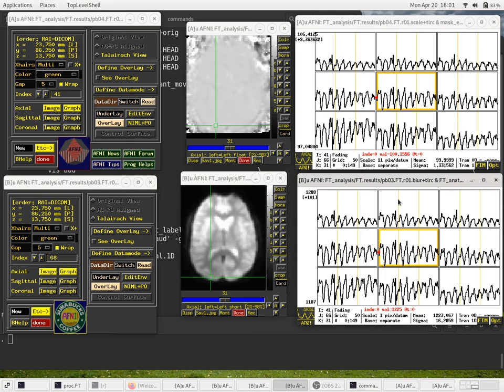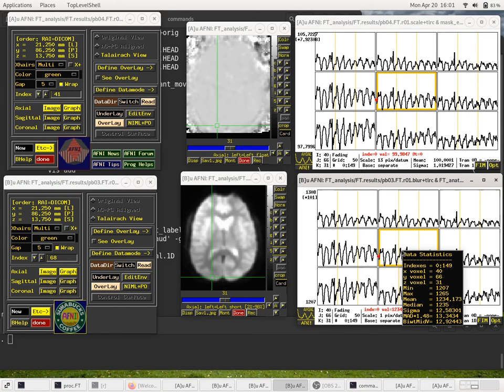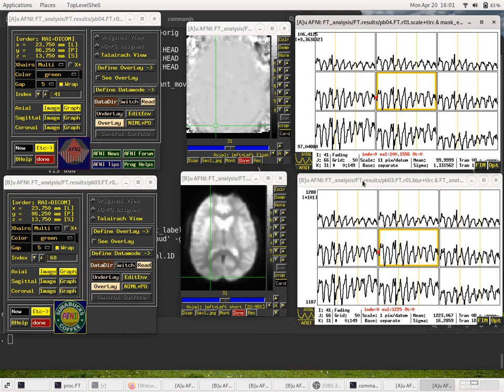It's just essentially to get from the bottom to the top, we're dividing by 12.23 to make the new mean 100 at this voxel. At a different voxel, just the neighbor, we're dividing by 12.34. Okay, so that's the effect of the scaling operation.